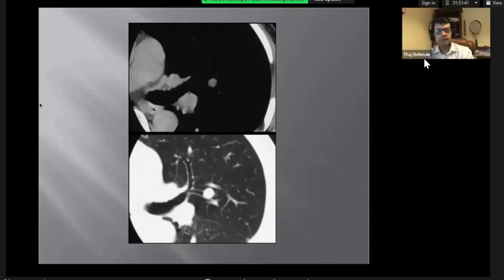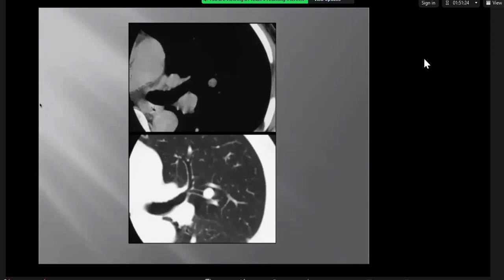Yeah, very good. Not many people, when I showed this X-ray, made the diagnosis straight away as an endobronchial abnormality, but you did very well, and you specifically said there is an endobronchial nodule. Why did you say that? Because if it's an extrabronchial nodule, I would expect it to be pressing or compressing the bronchus because it's closely related to it, and this is not happening.